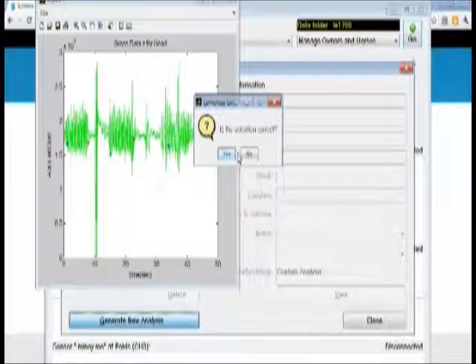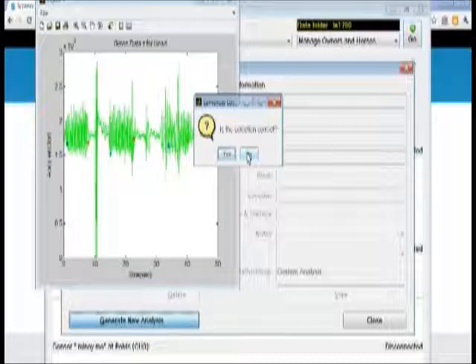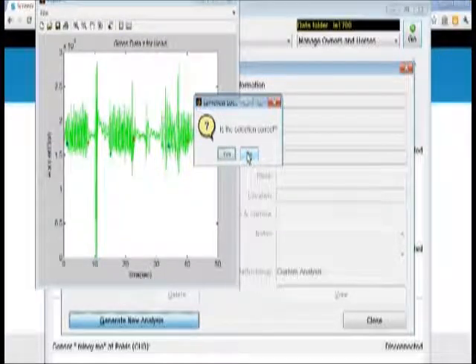diff head. This function is designed as an additional aid to remove forelimb strides with random vertical head movement caused by head tossing or shaking unassociated with normal vertical torso movement or lameness that were not removed by the standard Lameness Locator curve fitting algorithms. This function is only available to the user to remove outlying forelimb strides, since random vertical pelvic movement unassociated with normal vertical torso movement or lameness is uncommon.